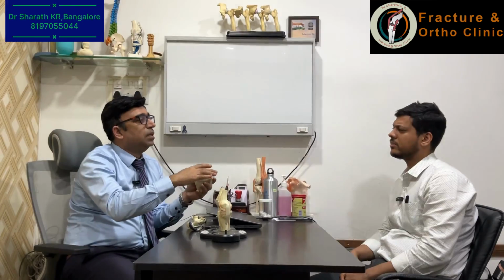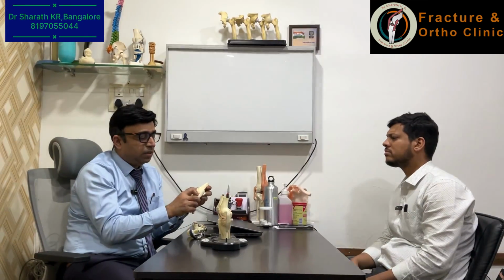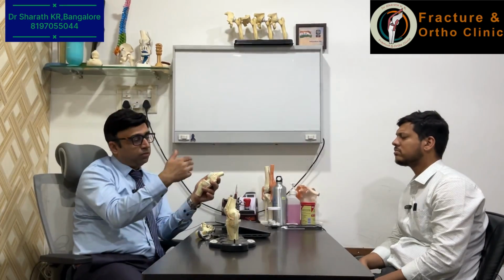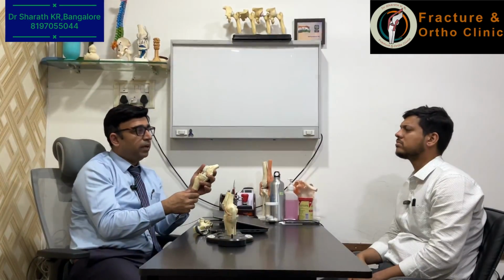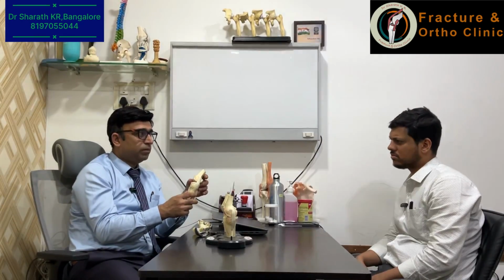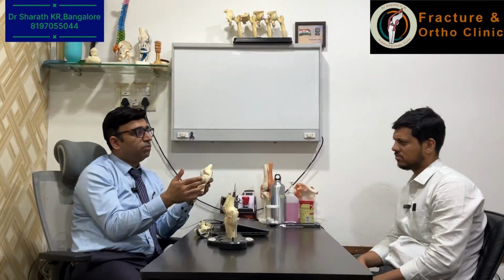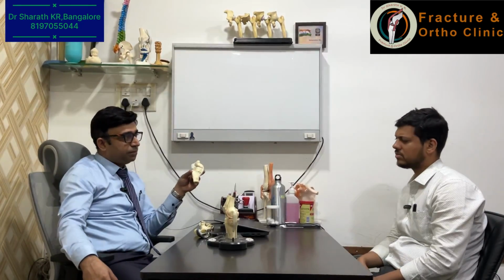Haptic boundary means the robot will create a boundary, so the saw will not cross the boundary. That is called haptic boundary. You might wonder what about the soft tissues, the blood vessels, the nerves during the surgery, will they not get damaged? Of course, the surgeon will himself be performing the surgery, the robot will be guiding. Along with that, if a haptic boundary is there, definitely it is an added advantage for a surgeon, so he can safely operate without any fear of risk of damage to vital structures.